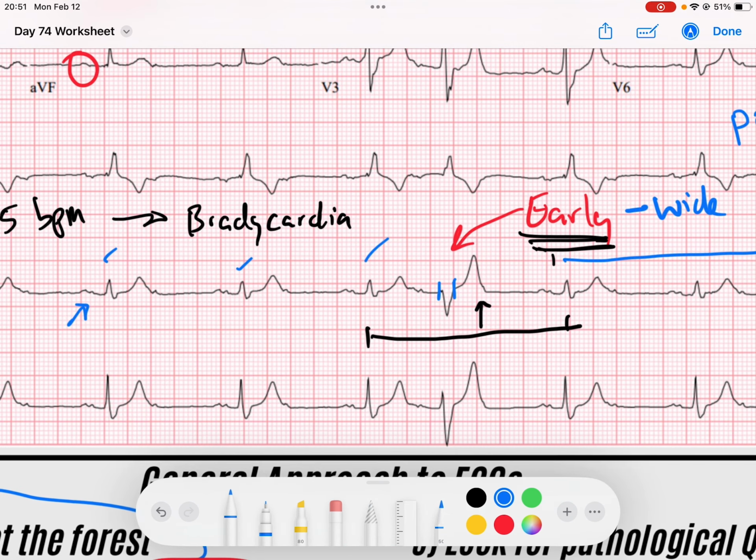And what you notice is you've got to look in front of it, and you can see that we've got a little kind of bump at the end of that T wave. And that, to me, is really indicative of a P wave or atrial depolarization. And so what you notice here is that we've got some atrial activity. We've got a PR interval that is a little bit longer than our normal PR interval. And then we have this QRS.